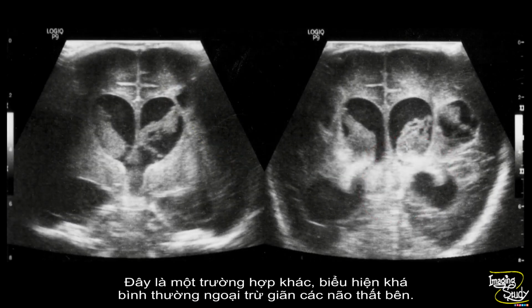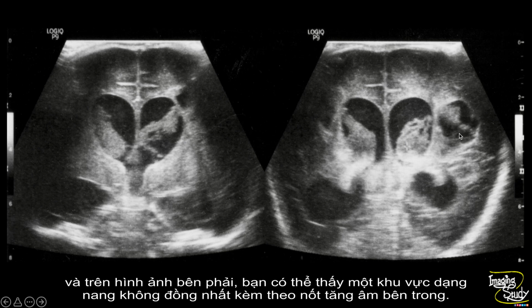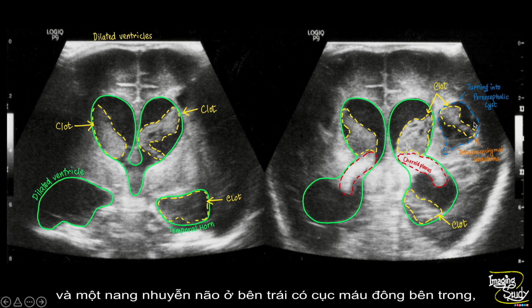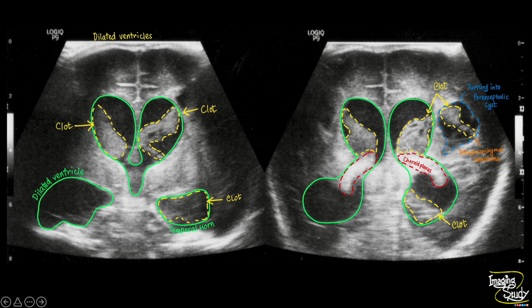Another case, it apparently looked quite normal other than the dilated lateral ventricles. If you look carefully, the choroid plexus doesn't look quite normal here. And on the right image, you can see there is an irregular anechoic cystic area with an internal echogenic focus. So this is nothing but asymmetrically dilated lateral ventricles with echogenic internal clots and a porencephalic cyst with an internal clot on the left side, indicating it as a sequela of grade 4 intracranial hemorrhage.